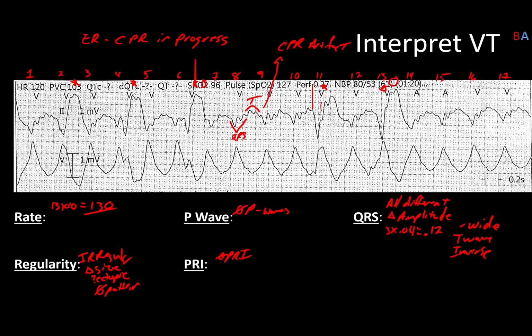Actually, I won't call them, I'll say this. This part here where they're kind of fibrillating up and down, those are not F waves. Some people might say, oh, maybe it's just a VTach or atrial fibrillation, or maybe atrial flutter, and that's what's causing all those. I really don't think it is. I think it's just artifact.